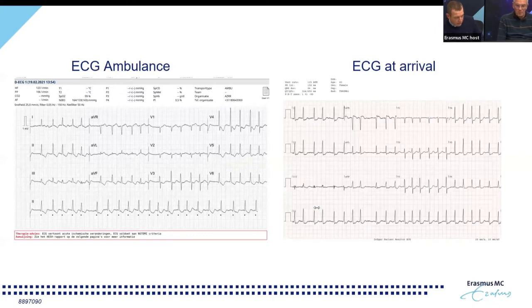This was her EKG at the time of presentation, showing atrial fibrillation with a heart rate of 135 beats per minute, with diffuse ST segment deviations and some slight ST elevation in aVR, suggesting potential left main or three vessel disease in this patient with an increased risk of cardiovascular disease and female gender, which of course could be a predisposing factor for SCAD.